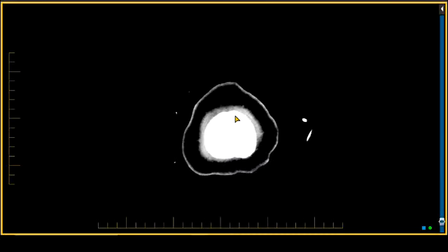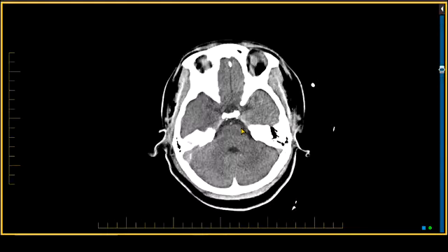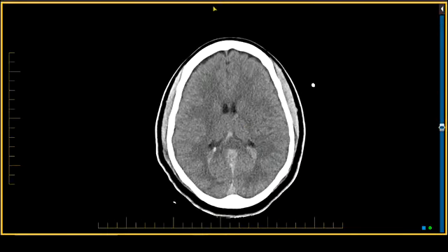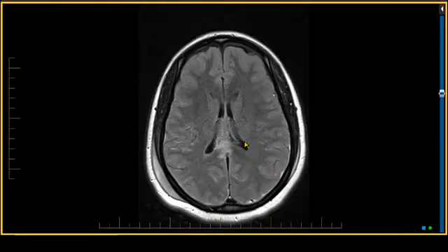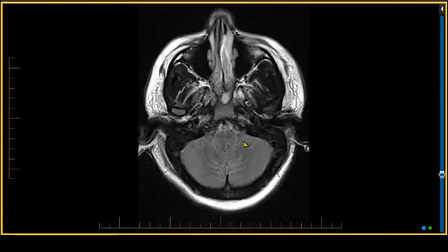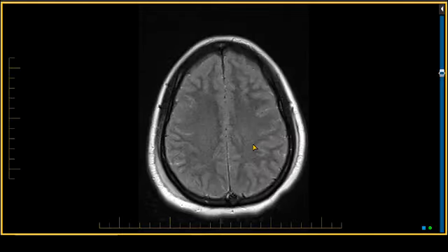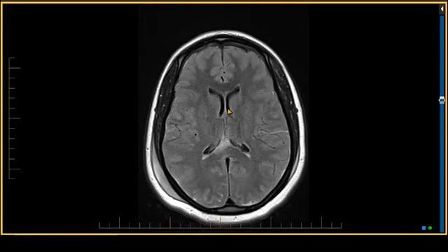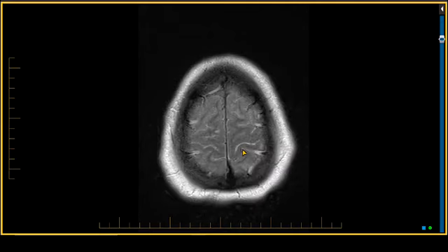Since the patient was doing very poorly and yet the imaging was relatively mild, the patient was referred for MRI scanning. The MRI scan, if we look at the initial FLAIR image, you note that the normal low signal intensity of the subarachnoid space that should be present on a FLAIR scan, as you can see in the cerebrospinal fluid of the ventricles, is lost over the high convexities. This bright signal on FLAIR scan is an indicator for subarachnoid hemorrhage.